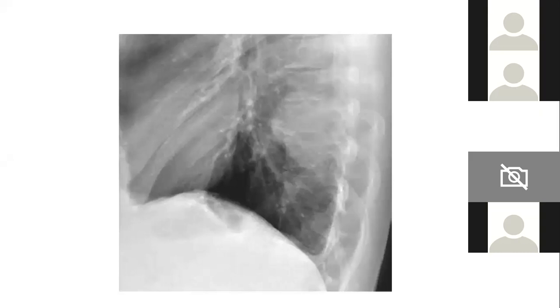Basically, it's the same. If you have to classify heart masses as middle mediastinum, the only thing is you will only know that the lesion is in the plane of the heart. Whether you keep it in the anterior or middle mediastinum is a different issue.